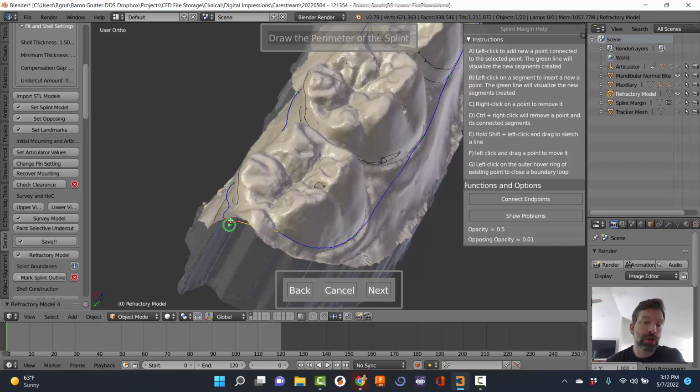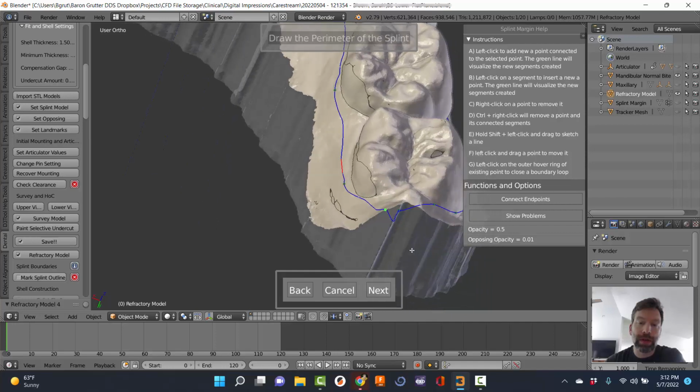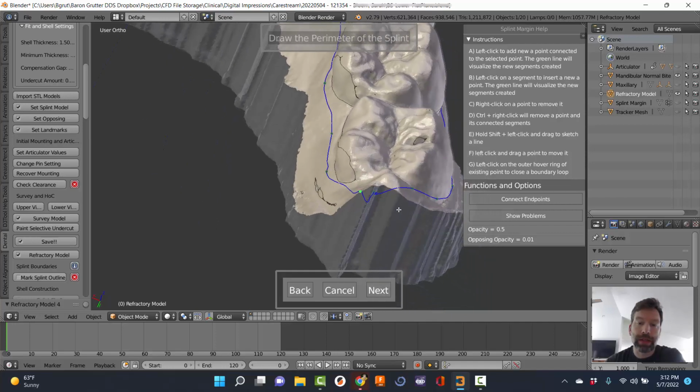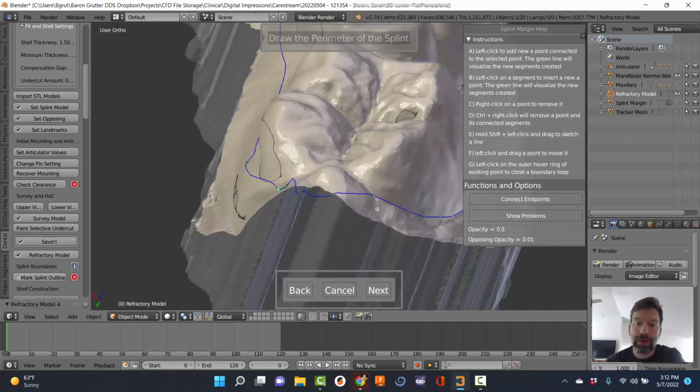And if it doesn't, what you need to do is go in and add some more points. See how it's falling through the model right there? That's why. So once I've done that, it's created this one, now it fixed it. So anyway, once in a while, you'll get these, and it's trying to figure out a way to fix it on its own. Okay? So by showing you that, I actually created more problems than anything.